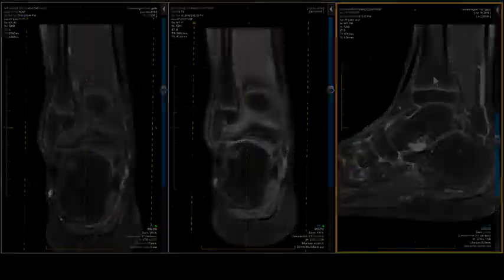That's a beauty. How important is the contrast? Very unimportant. First of all, do you really want to give contrast to an 11-year-old whose kidneys are still maturing? We know that neonates don't do as good a job at excreting gadolinium as adults do. So it's natural to think that a 13-year-old isn't going to excrete as well as a 21-year-old.